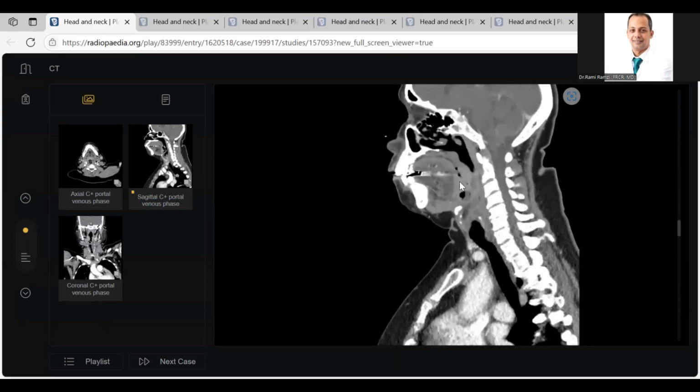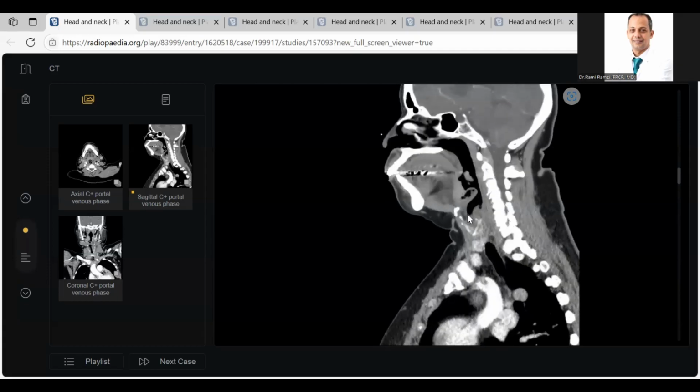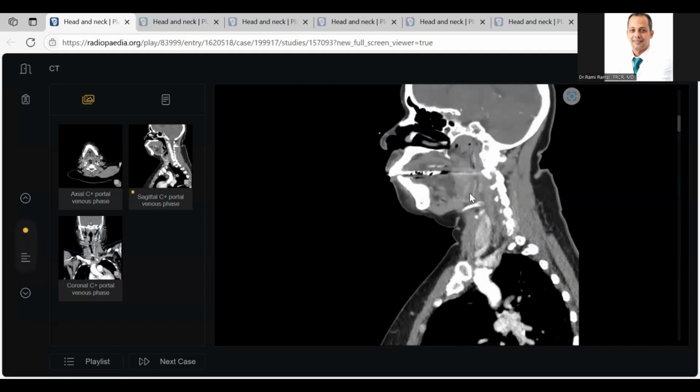What happened here? This is a soft tissue density enhancing lesion with an internal cystic component, and the patient has fever. So what's your differential? This is most likely infective etiology, abscess formation. Where is the anatomical location? In the hypopharyngeal region. No, this is not the hypopharynx. This is the oropharyngeal, the base of tongue. This is the epiglottis, epiglottitis. So what's your differential diagnosis?